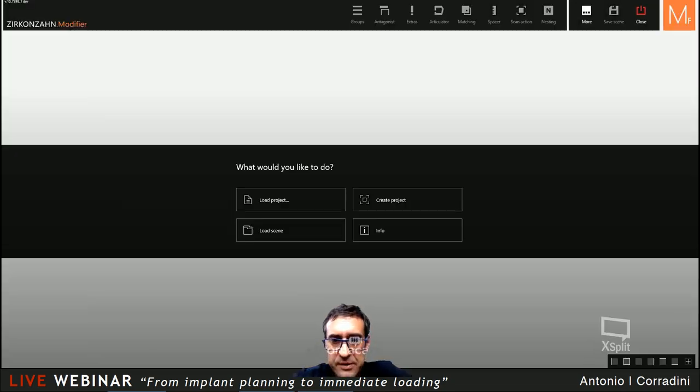Once I complete my project, I can start the Modifier directly. I can also go into the archive and then start another software. I can open directly and create a project.